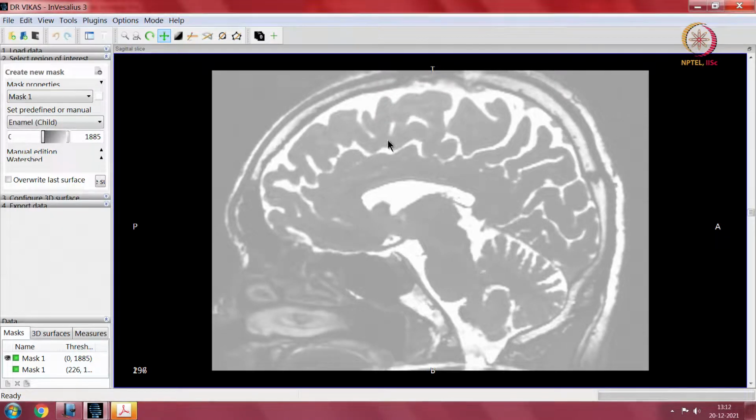So, this is the central sulcus which is coming from the other side into the midline. This forms the superior parietal lobule. Sorry, not superior parietal lobule. I think you should check it back. I am having a thought block there.